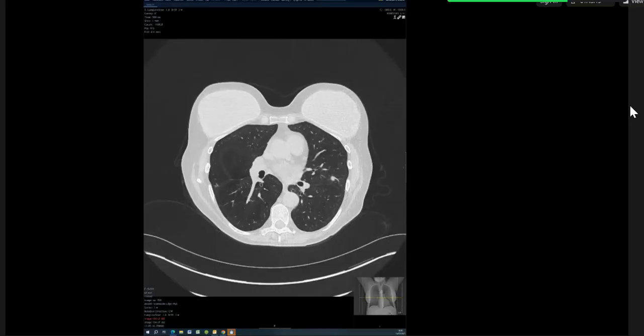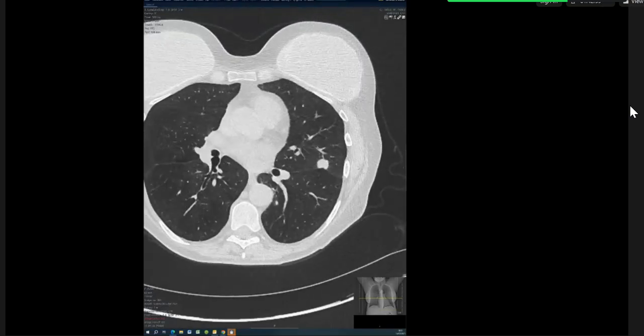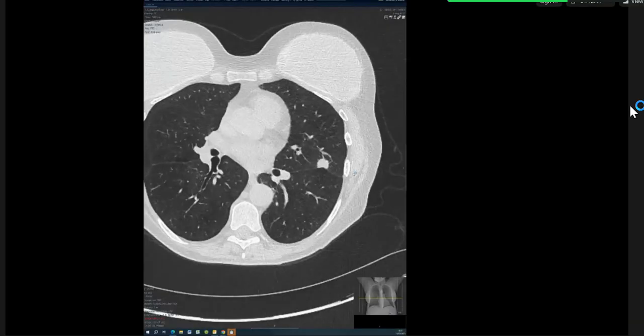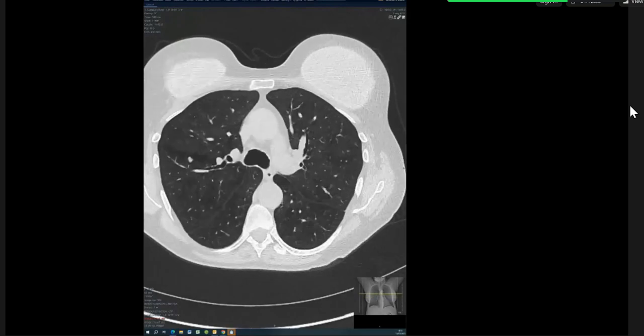Okay, do you want to describe that? Yeah, so there's a peripheral nodule within the left upper lobe. It's got mildly spiculated margins. And it's solid. I'm trying to see if it's homogeneous or it's got any calcification within or anything like that. It looks completely soft tissue. What else is it doing morphologically? It's pulling the oblique fissure anteriorly. It's causing traction. So what does that imply? Implies that it's invasive.